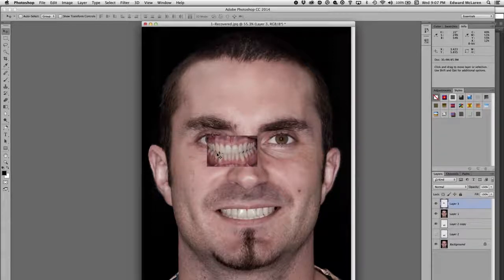It's a very popular tool that I use. It's the free transform tool, and again the hotkey, Command or Control T. So I'm going to bring that up. Command or Control T, there we go. I need to activate that layer first. There we go, that layer, Command or Control T, and there we go.